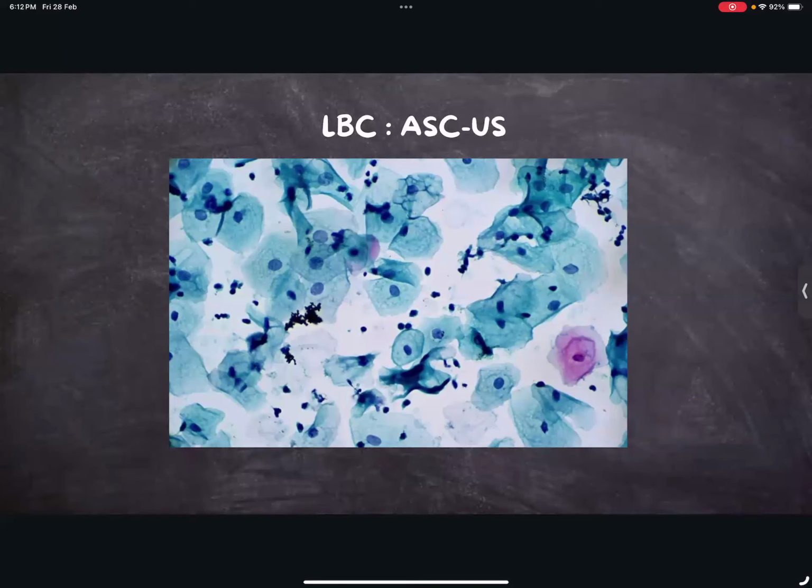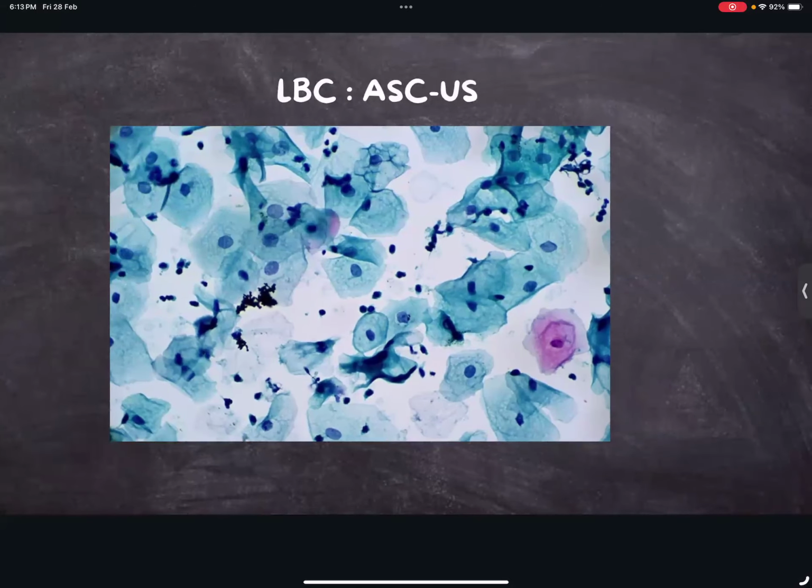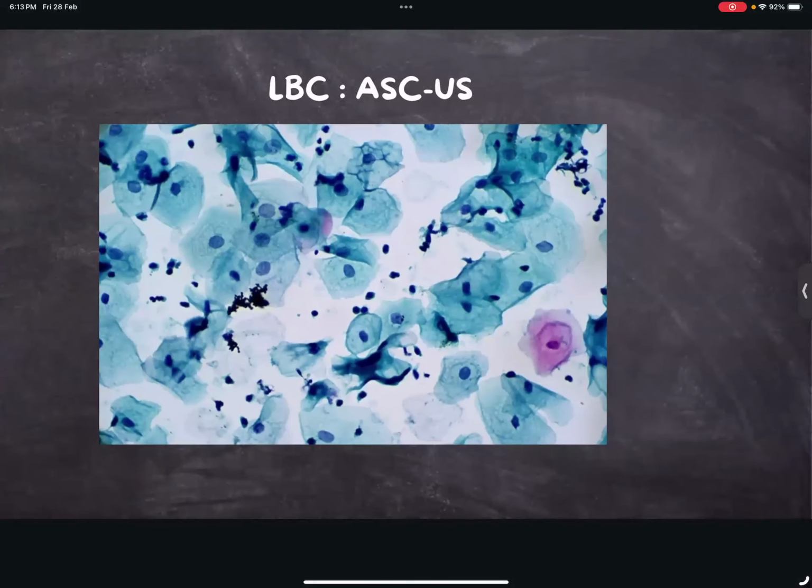Now come to our case. This is the ASCUS. ASCUS, atypical squamous cells of undetermined significance. The pink color cell is the superficial squamous cell, and the size of cell is just below the pink cell.